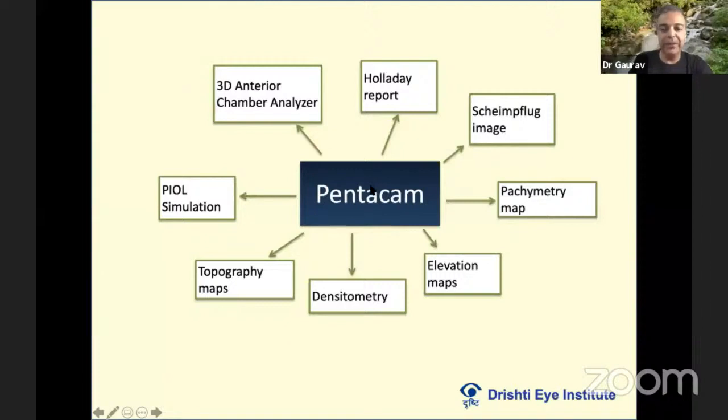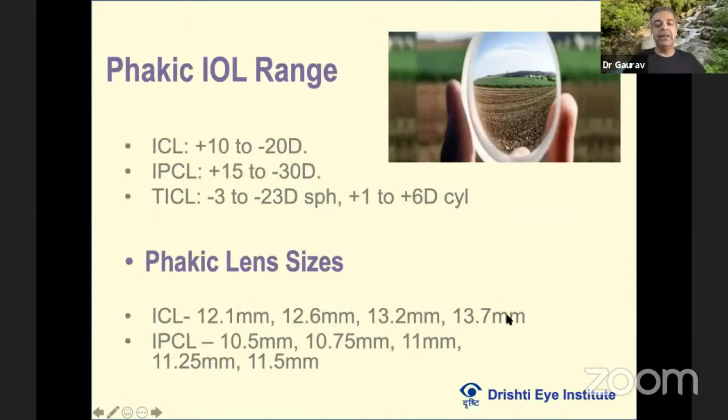The Pentacam, in addition to many other devices that we use for refractive surgery workups, can give you a lot of interesting stuff. And of course, we've gone through all of them. When it comes to phakic lenses, what Himanshu tried to tell was that sizing is the thing that interests us the most. Of the vault and the sizing, these are the two things which would interest us most when we are looking at all these devices.